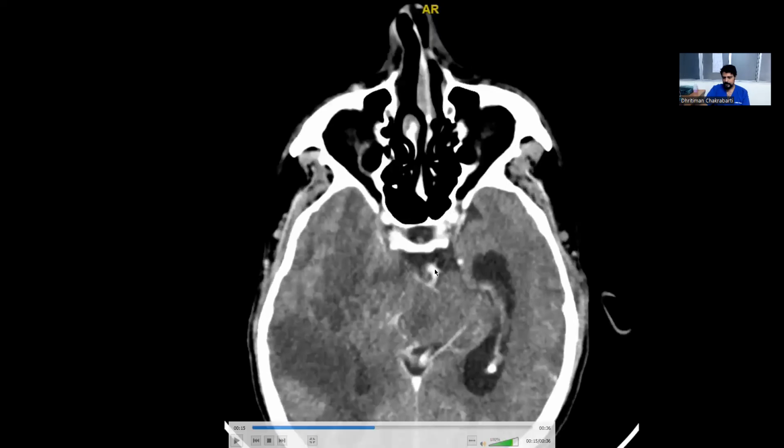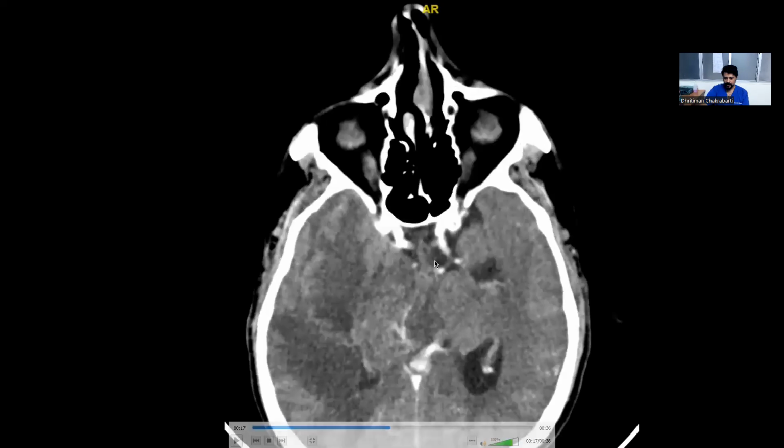Okay. So you're able to see some arteries coming out of the basilar, and very soon the basilar is gone. That is because it has split up. Now, the problem with CT scans is that they have very big slices. Basically each slice is 5 millimeters thick, so finer details will be lost. You'll be able to see this much better in an MRI.